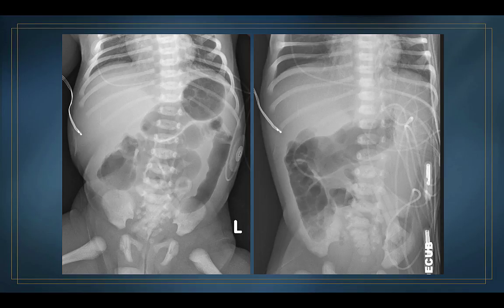So the decubitus, as I stated on that earlier slide, may clear the issue of what bowel loops you're looking at. It may just be simple normal caliber colon. Because again, if this was small bowel, it would be extremely abnormal, even if it didn't have an air fluid level in it.